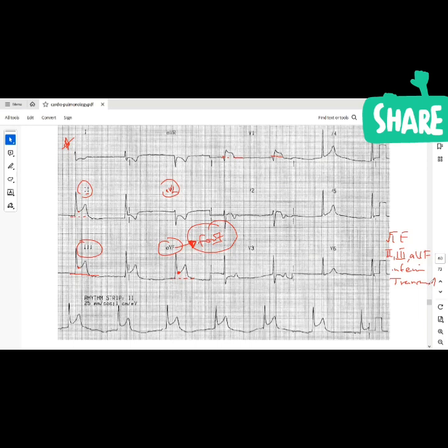So what will I see? Which coronary artery is affected here? Which is responsible? I think it's likely the right coronary artery. Which branch of the right coronary artery specifically? Is that the PDA? And what lesion will you see in the PDA in this person? What level of occlusion? Oh, 100%. 100% occlusion.